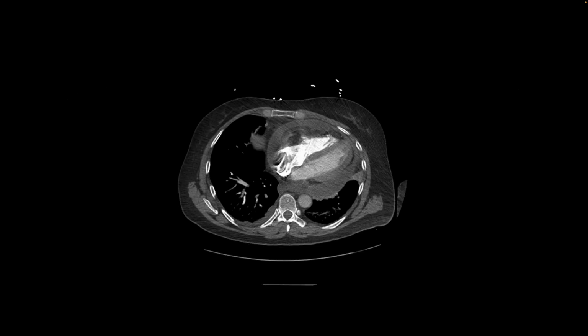This is our next patient. We have a single image from the CT of the chest showing a moderate to large sized pericardial effusion. We see this hypodensity or fluid. There is some rim enhancement of that also involving the pericardium, and it looks like there is compression of the ventricles, and there is bowing of the septum towards the left side, and so this pericardial effusion is constricting the heart, and it's not allowing it to fill in completely and empty out with each heartbeat, and that is called cardiac tamponade.